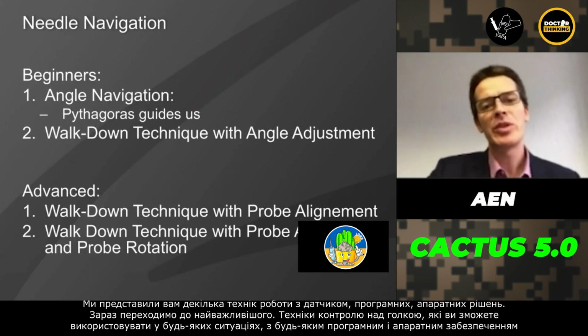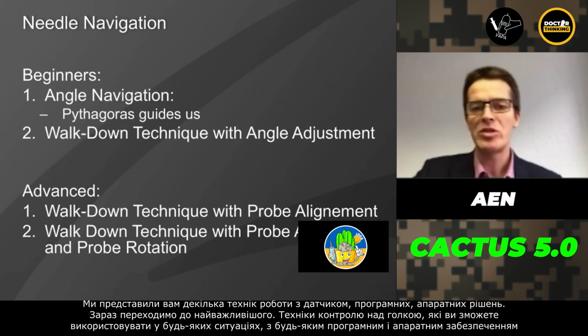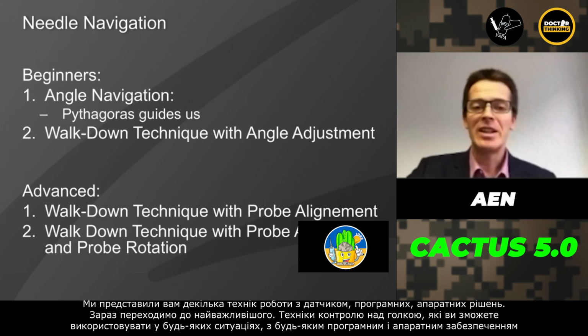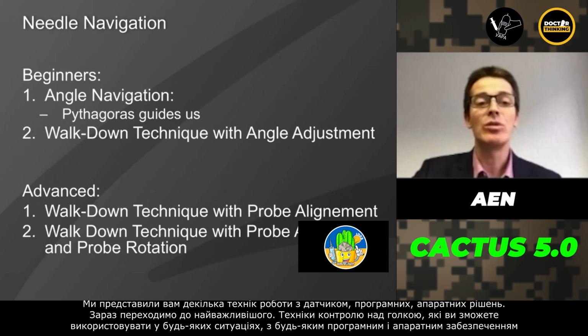Okay, now we've presented some probe handling techniques on how to improve needle tip control. We have presented some software solutions, some hardware solutions, but now we're coming to the most important thing, the needle navigation techniques, which you can use in any case, whether you have any hardware or software assistance or not.